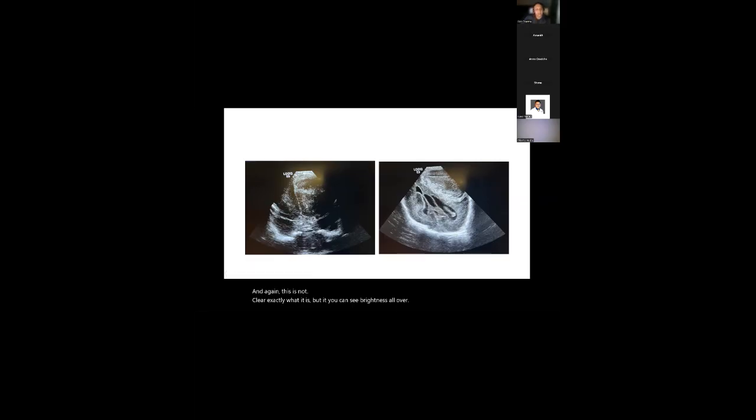Can I just ask, was there instrumentation in this baby? No, and it was a cesarean. Okay. So you've got the midline, which is shifted. You've definitely got this area over here. Why it's brilliant is because you've got brightness and a hypoechoic region over here, which from my perspective is definitely causing an element of midline shift. Now, the question is what this is. Over here, you can see a hyperechoic margin again with a hypoechoic lesion. It could represent blood in the parenchyma, but it could also represent a subdural or an extradural bleed.